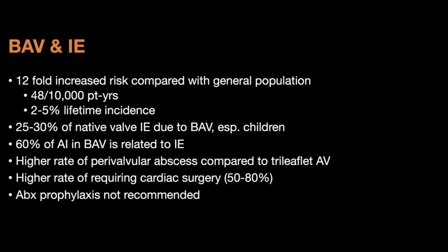Usually they present with stenosis. And then there are the higher rates of paravalvular abscess that we saw in this patient, again, in bicuspid compared to patients with normal tricuspid aortic valves. A lot of these patients require cardiac surgery, just like this patient did.